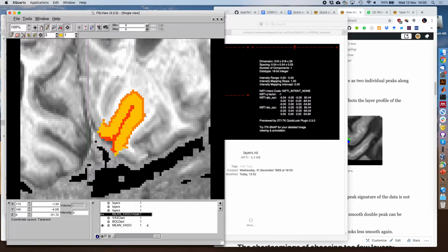I think it makes sense, but yeah, it's hard, especially also considering that different parts of the brain have different gray matter values. So your partial voluming model is always kind of biased. Or for example, you would choose your gray matter CSF border at a voxel that is half filled with CSF, half filled with gray matter, right?